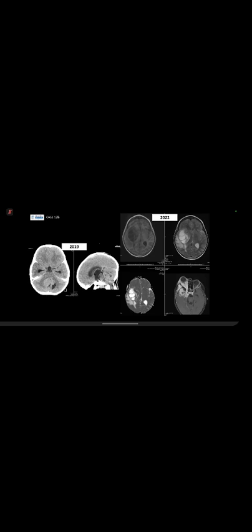it's just an interesting case because you should take note of the timeline. If you hadn't gotten that this was some sort of brain tumor, because I think it looks fairly aggressive, right? Because you've got your hydrocephalus there as well. And again, posterior fossa, you would think brain tumors first. And then if you start to see 2022, why have things changed? And things do look fairly aggressive, with cystic components, although I didn't give you the full slices.